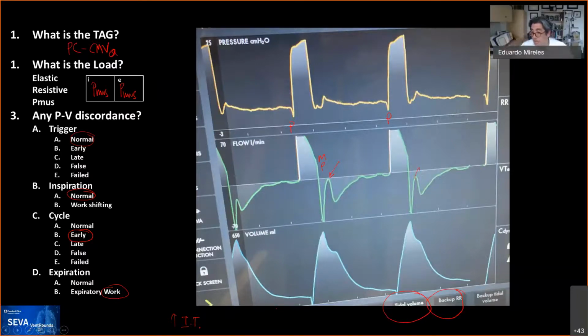So it looks, actually, yes, like a false trigger, but it's not a false trigger, well, actually not a failed trigger either. It's not a failed trigger in this case because it's still the same inspiratory effort. The patient was still, it's a long inspiratory time. So if I would draw the muscle activity here, you would probably start over here like this. This is a spindle of muscle effort, and it would still be occurring all the way to here.